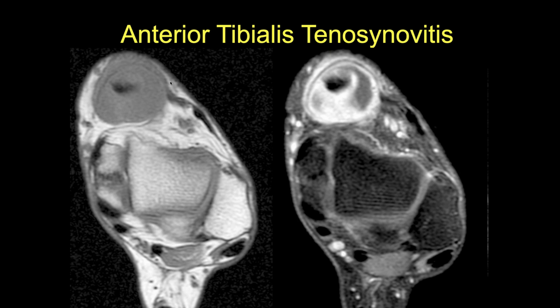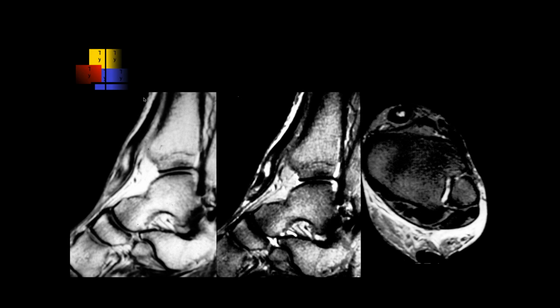Tenosynovitis. And there might be a little bit of tendinosis or tendonitis here with the indistinctness, but a lot of this is just fluid around it. This is a patient who had rheumatoid arthritis. Thank you. Okay, Ashu.